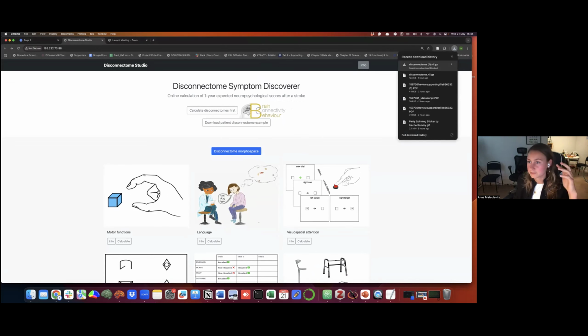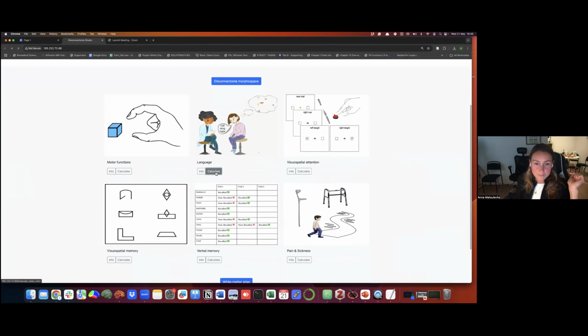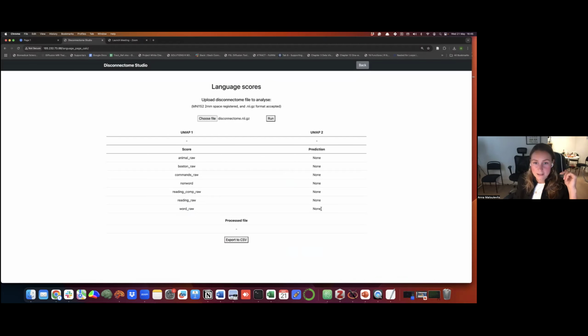It's an insecure file. Great. We'll have it here. I'll just put it on my desktop, and then you can proceed: choose the file from the desktop, the disconnectome, open it, and run the thing. At the end, it takes a fraction of a second basically. And at the end, here it is. So you'll have the coordinates of the UMAP, right?